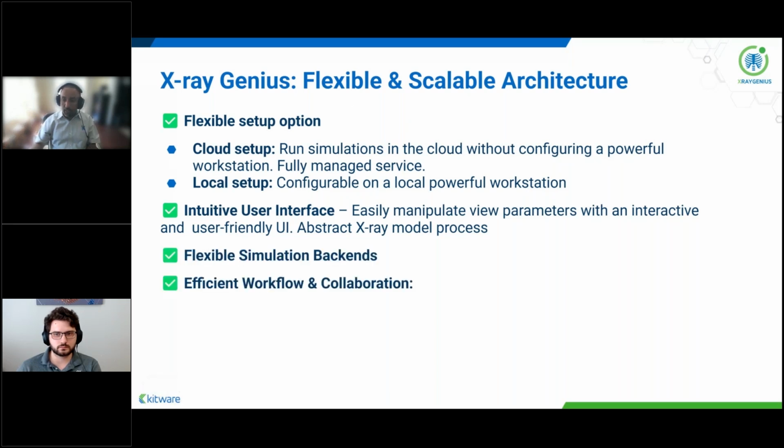Next is the actual simulation, which can be done in different ways, and it was very important for us to design a flexible simulation backend. So X-Ray Genius has a modular backend that supports different simulation frameworks. The demo that we'll show today uses a deep learning based simulation pipeline called Deep DRR, but other types of simulation pipelines can be used as well.